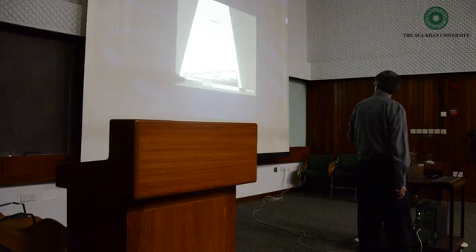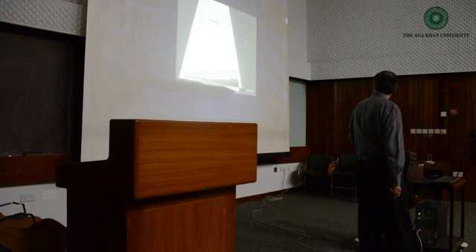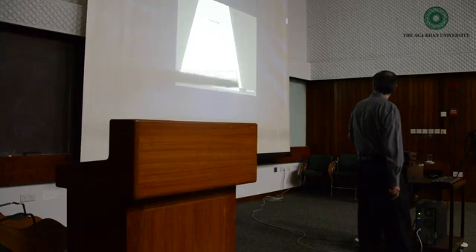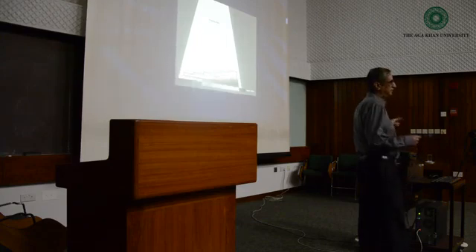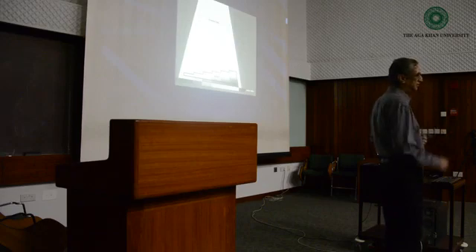So this is one end of the spectrum, very black, most radiolucent, so this is air. And this is very thick, so this could be the bone and it is the whitest. Or if this is white and this is the bone, then this could be metal. So metal appears extremely white because it is most effective in cutting off the radiation.